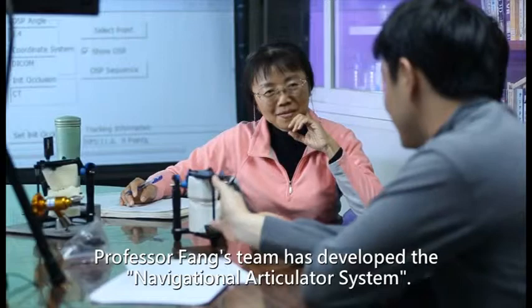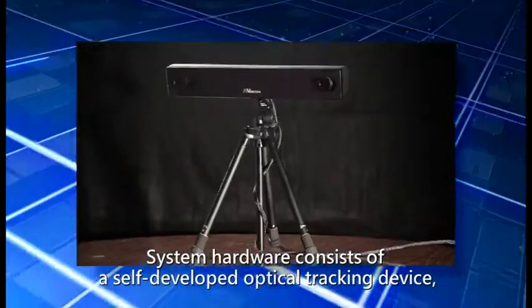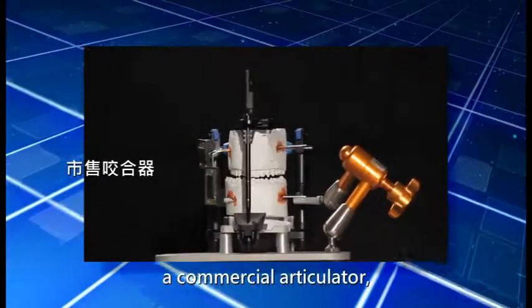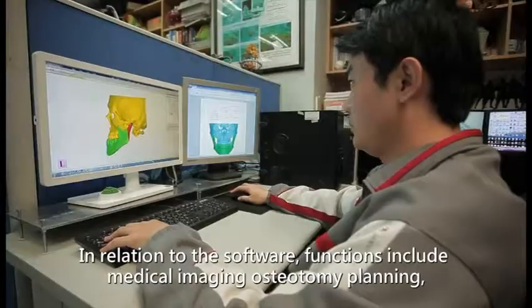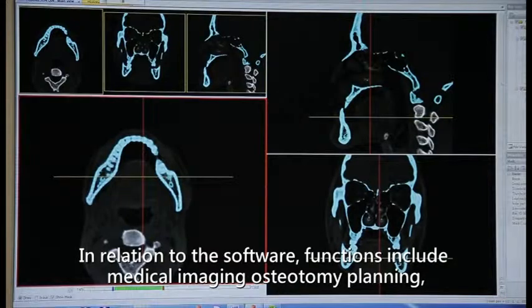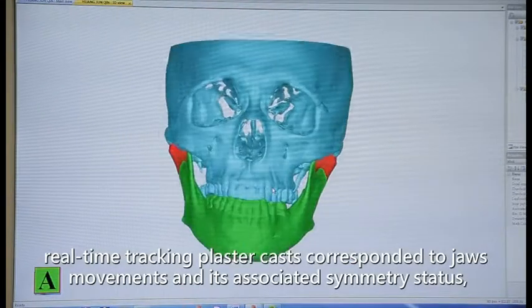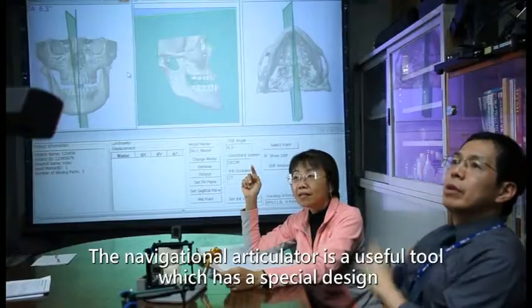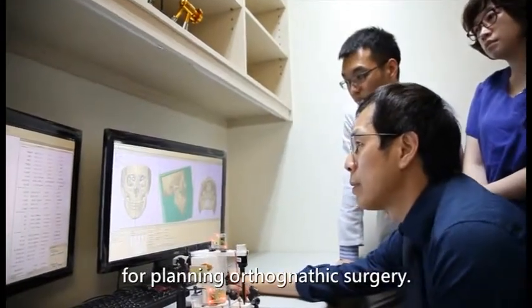Professor Fang's team has developed the Navigational Articulator System. System hardware consists of a self-developed optical tracking device, a commercial articulator, and a self-developed articulator fixation base. In relation to the software, functions include medical imaging osteotomy planning, real-time tracking plaster casts corresponded to jaw movements and its associated symmetry status, and dynamic cephalometry information. The Navigational Articulator is a useful tool which has a special design for planning orthognathic surgery.